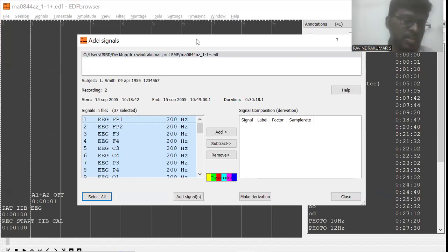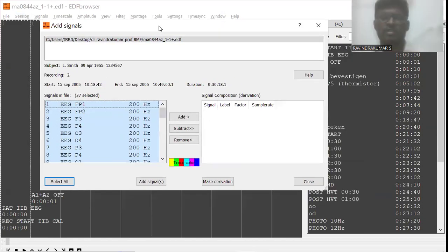You can see that this is a multi-channel signal, because most physiological signals are multi-channel. These signals have been recorded by using different electrodes. Each electrode has its own signal, and it signifies one of the features or parameters. For example, for the EEG, we take signals from different lobes: the occipital lobe, temporal lobe, and frontal lobe. Each lobe has its own significance.